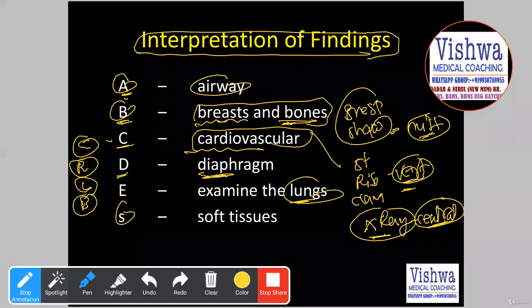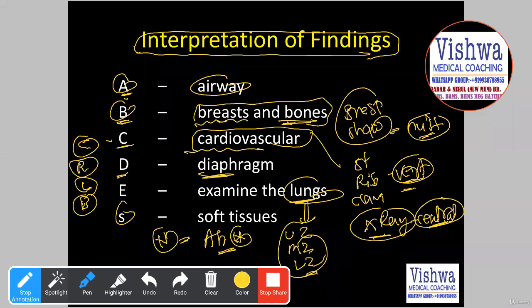In the first lecture, we examined the upper zone, middle zone, and lower zone. Remember, all three zones look a little differently. The last lecture was on normal X-rays. Today we will look at some of the abnormalities. This presentation has about 130 slides, and we may require three or four lectures to finish those, so that proper understanding can be made.